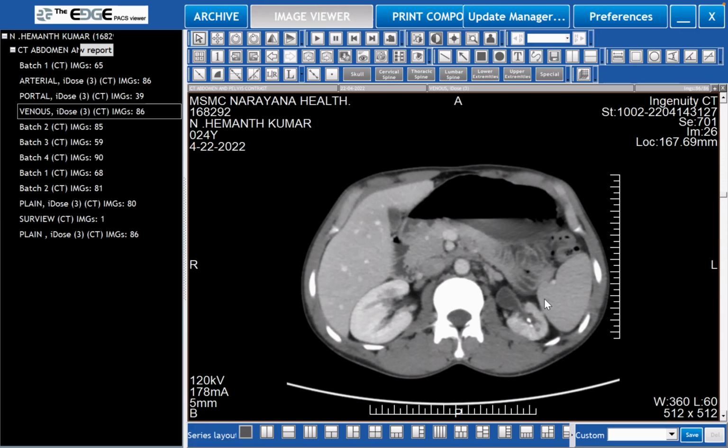Remember one more thing, that the ureter is a very flimsy structure and it is easily or better identified when there is contrast within it. If there is no contrast and if the ureter is seen on the plain film and it's got all these features, then maybe there is pathology. That's why you're seeing it. It's the pathology in that ureter which highlights it on the CT scan rather than actually the contrast in the ureter. You understand what I'm saying? Yes, sir. All right.